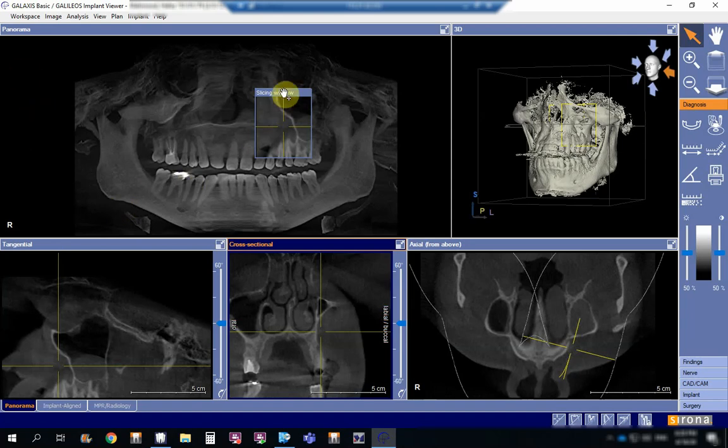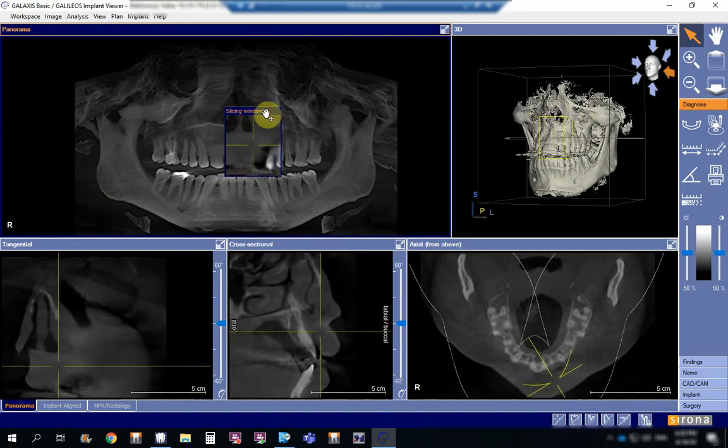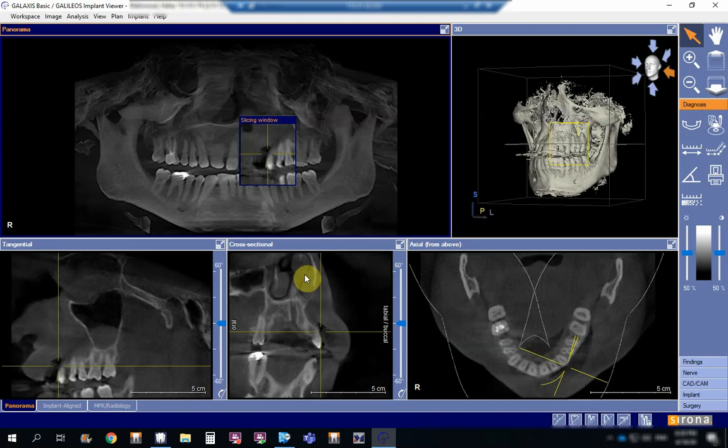Today we're going to talk about the measurements that can be done in the CBCT, and we know that in the measurements of the CBCT, unlike the conventional radiographs, that is the 2D radiographs, all 2D radiographs have a common problem, that the images which we see are actually bigger than reality.